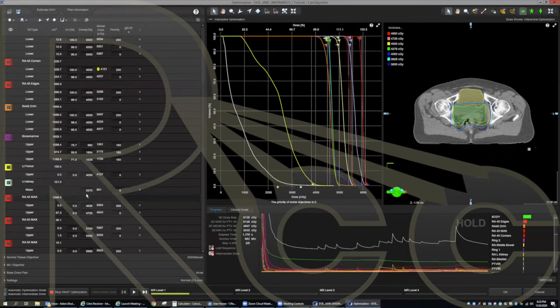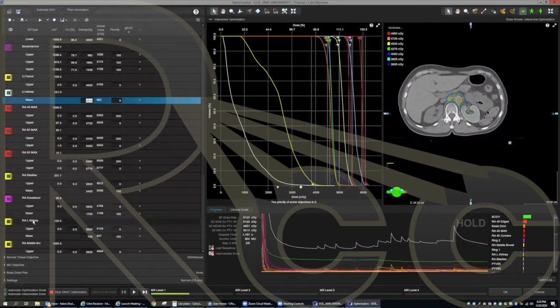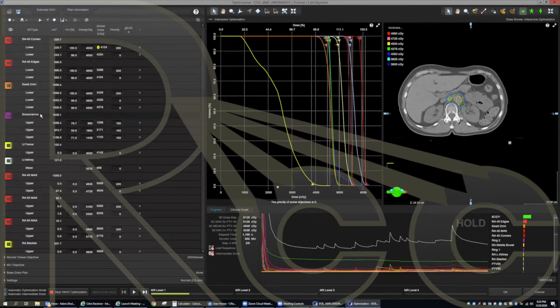How did I miss my left kidney? Sorry, guys. I don't know what happened. We're changing something else for the left kidney. Oh, I've got a kidney here. I've got two left kidneys. Because you were using the RA output. All right. I could have sworn I was doing it. Okay. Not that crazy. So let me get rid of this before it confuses me.